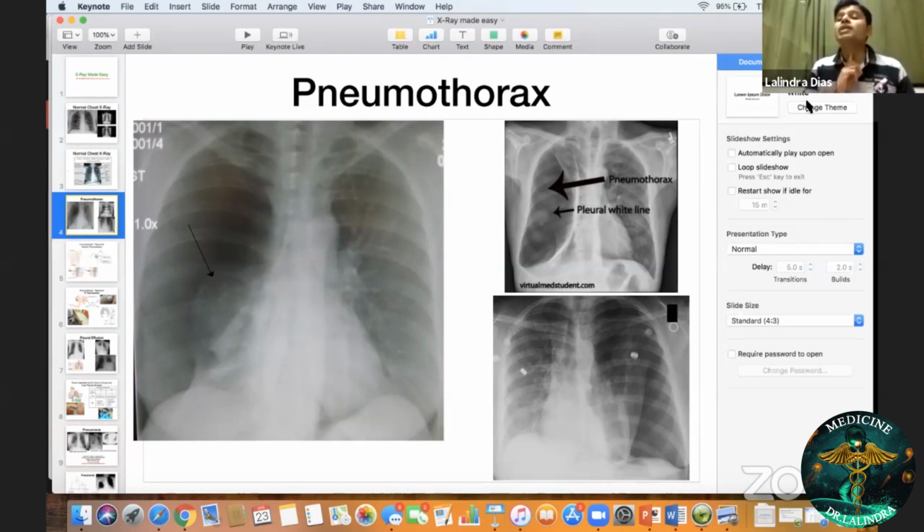And due to this pneumothorax, if I have got a pneumothorax on my left lung, due to the pressure from there, the trachea will be pushed to the opposite side. So the trachea will be kicked to the opposite side. So tracheal deviation also can be there in a tension pneumothorax. It's a dangerous condition. Patient can die instantly like this.